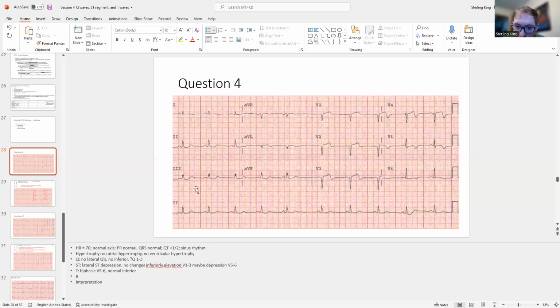And the T waves here are up, potentially biphasic, not bad though. So let's leave it. I think that one's probably biphasic. It goes up and it's got a nice dip back. V4 definitely, V5, yeah, V6 maybe. So I'd say V3 to 6 biphasic T waves. A little bit of overlap because I already interpreted it there, but I expanded the field.